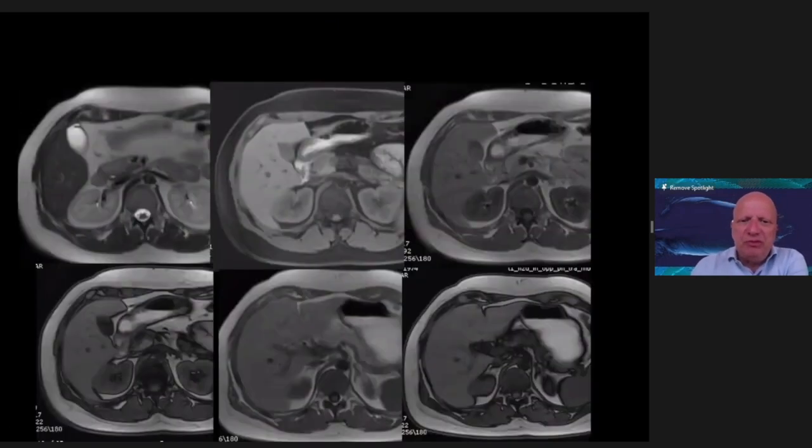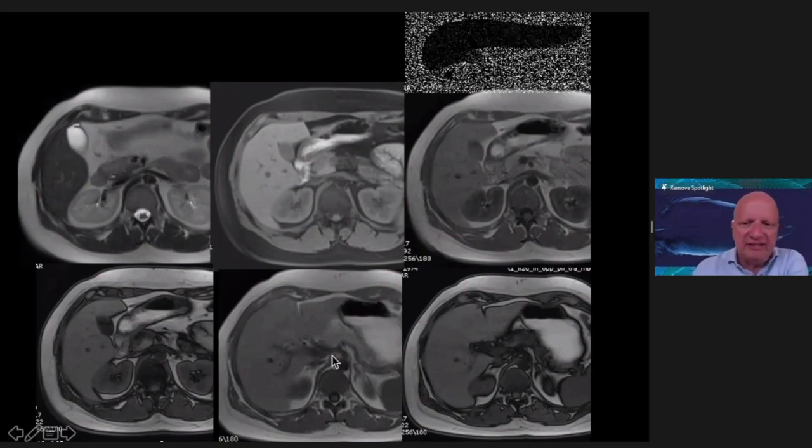Among pseudo lesions, sometimes we can easily observe, especially with the in-phase and out-of-phase images, the ventral zone of the pancreas, but also with other sequences, a difference of signal intensity between the dorsal and the ventral zone. This is more easily evident in out-of-phase images, where there is a drop of signal intensity in the dorsal pancreas, while the ventral pancreas maintains its normal signal intensity.